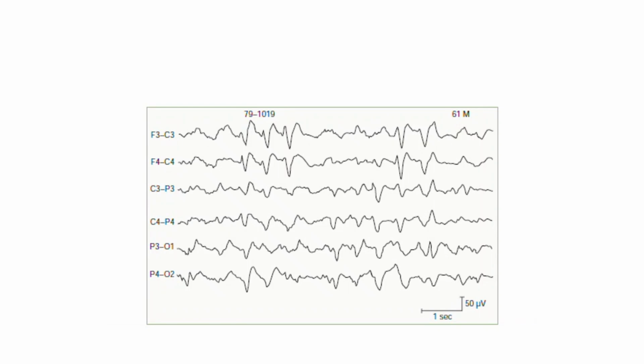This EEG tracing illustrates one of the most classic and distinctive patterns in clinical neurophysiology: triphasic waves secondary to hepatic encephalopathy. While historically considered pathognomonic for hepatic failure, these waveforms are more broadly recognized today as a classic signature of severe metabolic encephalopathy, including uremia, severe electrolyte imbalances, or anoxia.